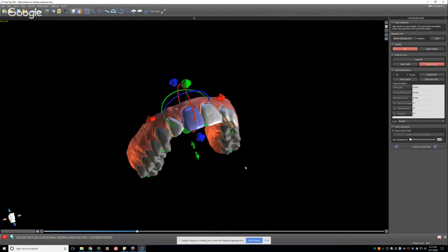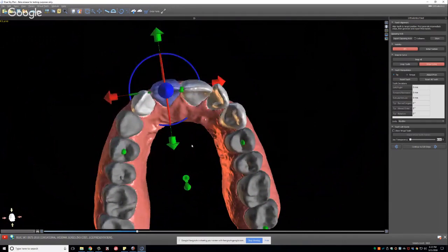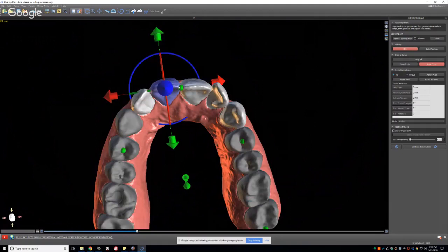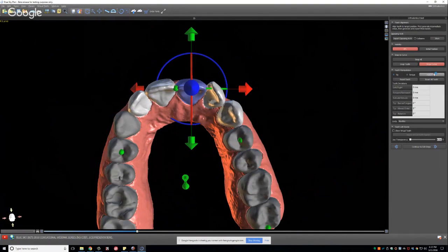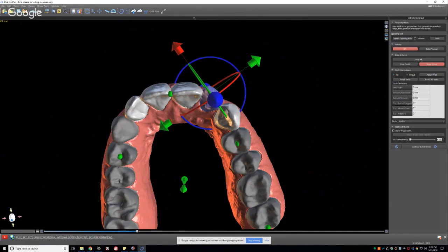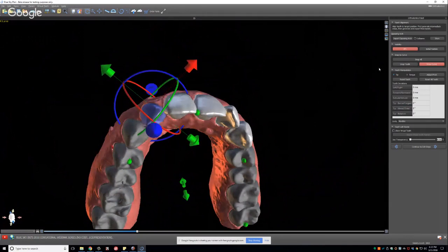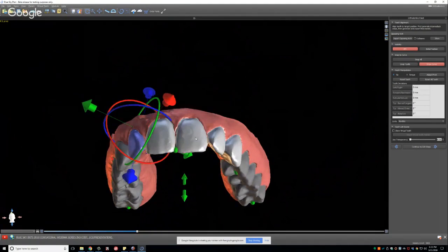So now I want to show you that as I mentioned before, when you put the dots, that's how it knows how to align these lines, or as we call it, the pivot. So if you don't put the dots right, it doesn't know how to align it up. That used to be an issue with the software. It didn't understand, and it had to just guess, and it was maybe right 50% of the time.